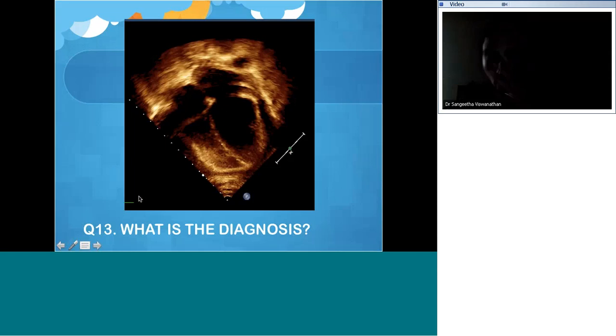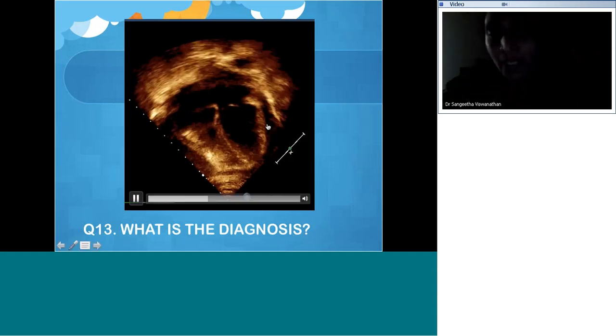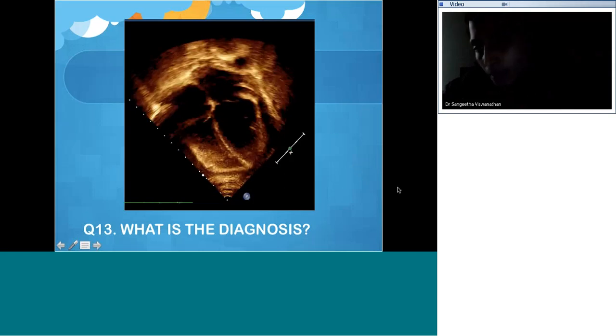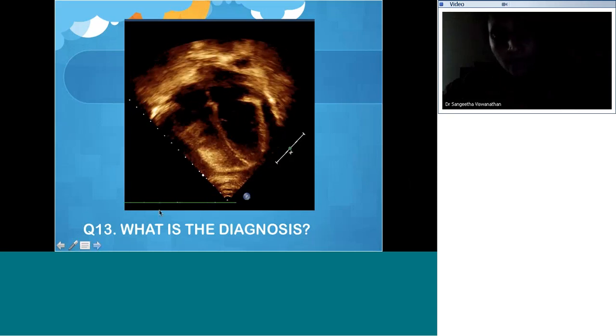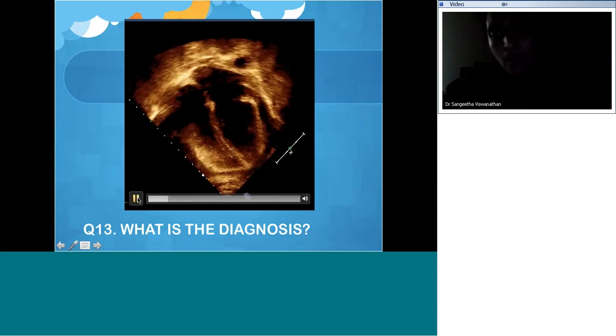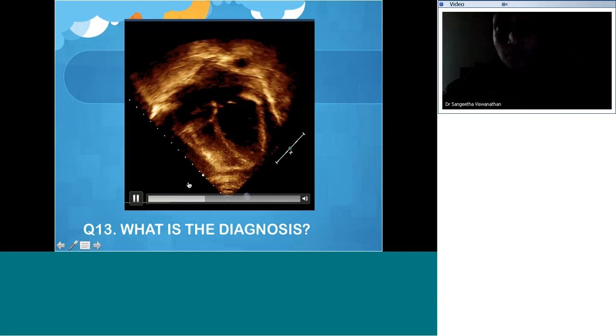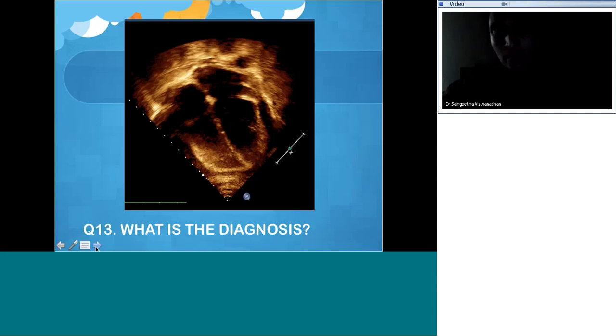Okay, so what is the diagnosis here? The echo projection I'm not very happy with, but anyway, so what is the diagnosis here? We'll go back to that. We'll finish this and we'll go back to that. So, what do we see here? What is the diagnosis?